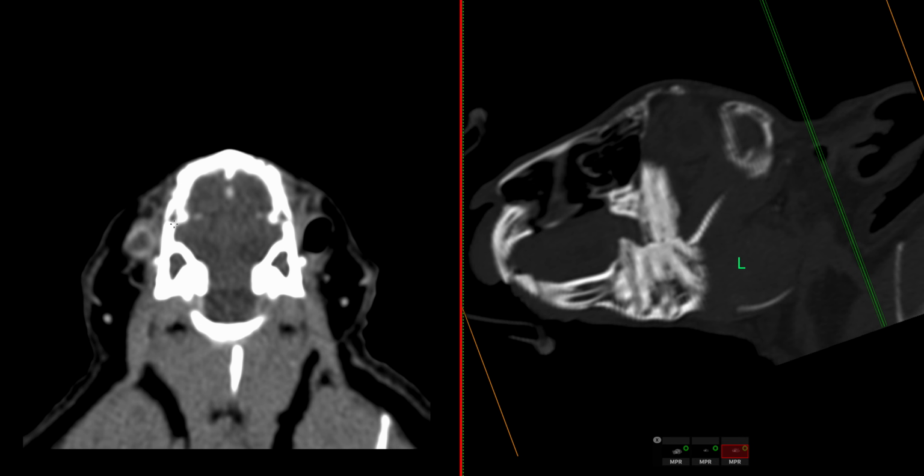So concluding, in this rabbit, we have mild to moderate overgrowth of the maxillary and mandibular cheek teeth, and we have thinning, which is probably due to atrophy of the mandibles, of the cortex of the mandibles, associated with the reserve crowns of the mandibular cheek teeth. And then we have also right external otitis.